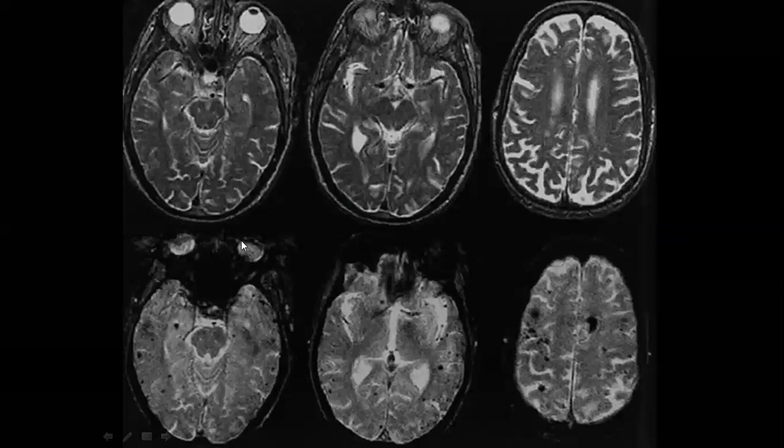Okay. This case, yeah, not a very good picture, but what did you suspect with these multiple lesions? Yeah. So one of the differentials will be amyloid, and the other differential, if you haven't seen it before, what could it be? Multiple cavernous hemangioma. But here it is amyloid.